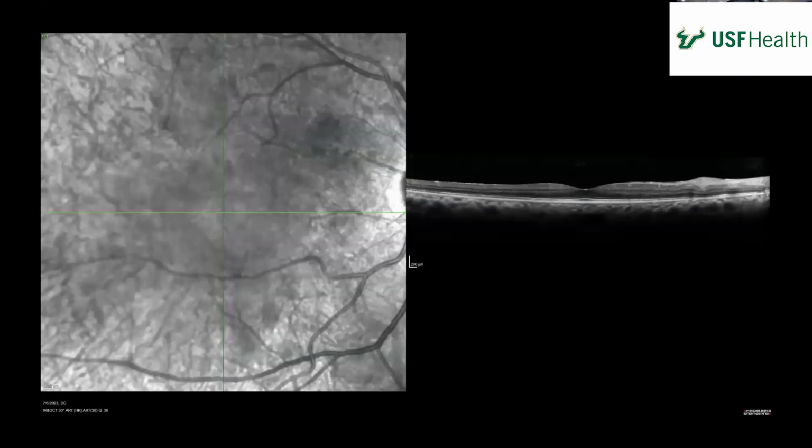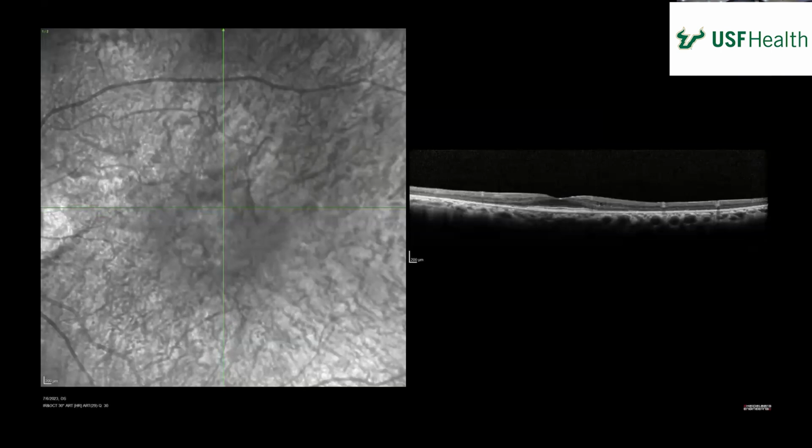One more back. There you go. One more forward. One more back. There you go. Vertical cut, horizontal cut. Next slide. Vertical cut. Just so skinny. And you can then see a little bit in the other eye. There was a little bit, yeah.